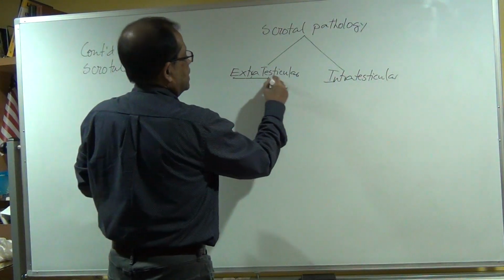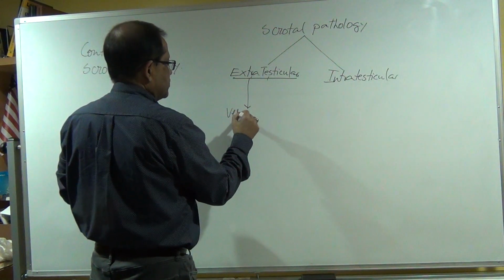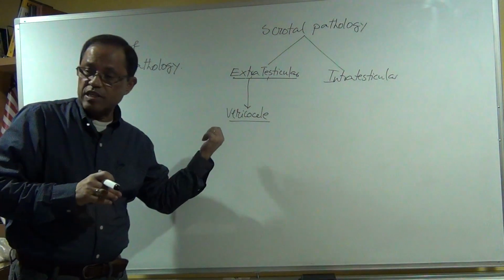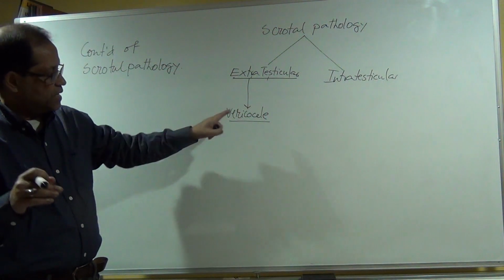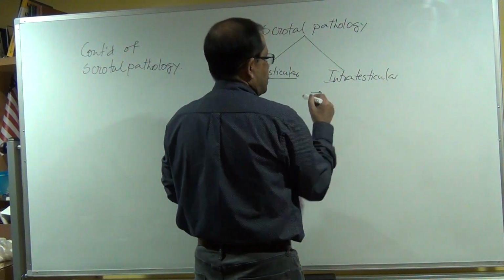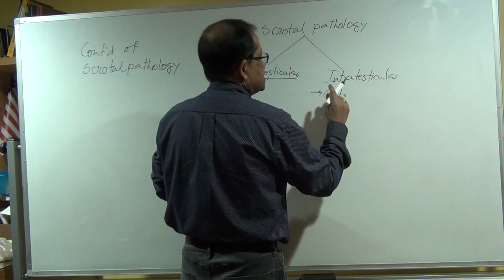Okay, the varicocele I will discuss separately, but it is extratesticular. Am I right? It is not within the testis, it is outside. All the veins are extratesticular. Just note it. Okay, intratesticular pathology, number one, you will see cyst.